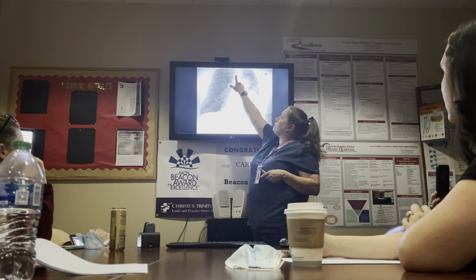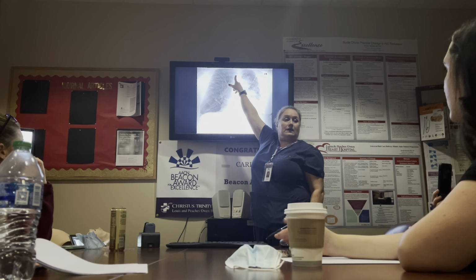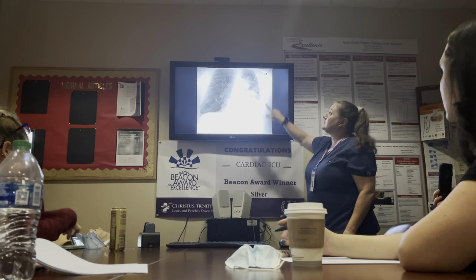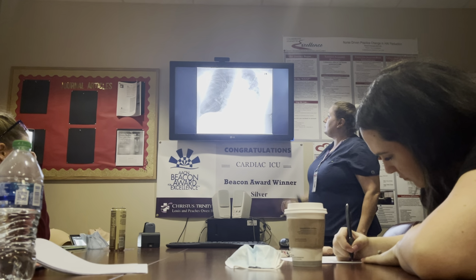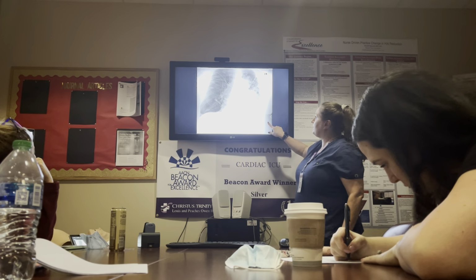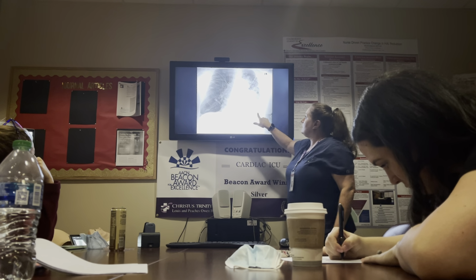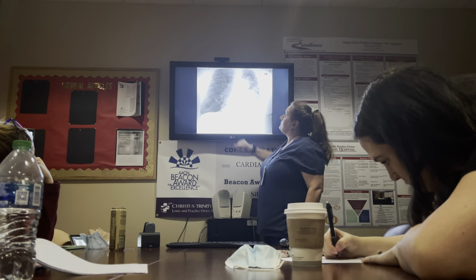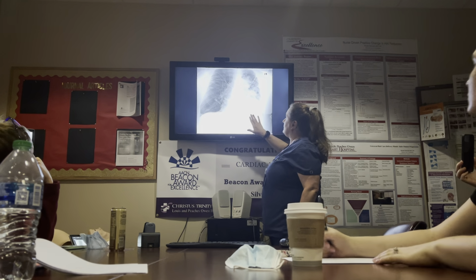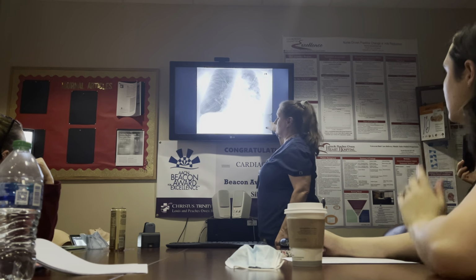This one's actually got a trach. When you look at this particular patient, this is a ringed tube rather than a regular endotracheal tube, which tells me that that's a tracheostomy tube, okay? You have to really get up close to look at it, but this stuff here is part of all of the apparatus for the breathing. These are the leads on the chest that are outside of the chest, okay? But this is a pneumonia here. This spring here is part of the apparatus that's outside of the chest.